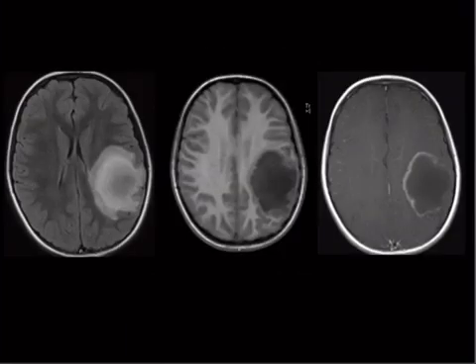All right, so moving on. Here's another case. So, let's go through these. This is a really important skill. I'm going to do this repeatedly throughout all these neuro lectures. You'll get sick of me doing it, but it's super important that you do it. You cannot give up points on this stuff. So let's figure out what these are. All right, so this guy here. CSF is dark. Two things have that, T1 and FLAIR. White matter is white on T1. White matter is dark here, so that's FLAIR.